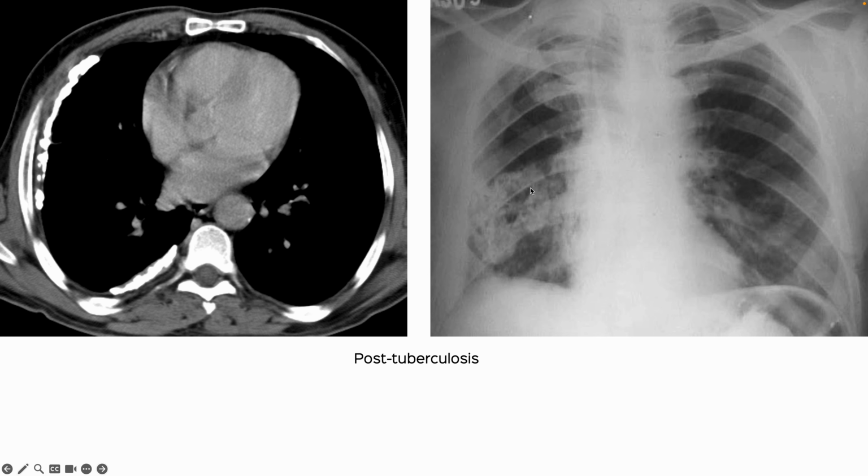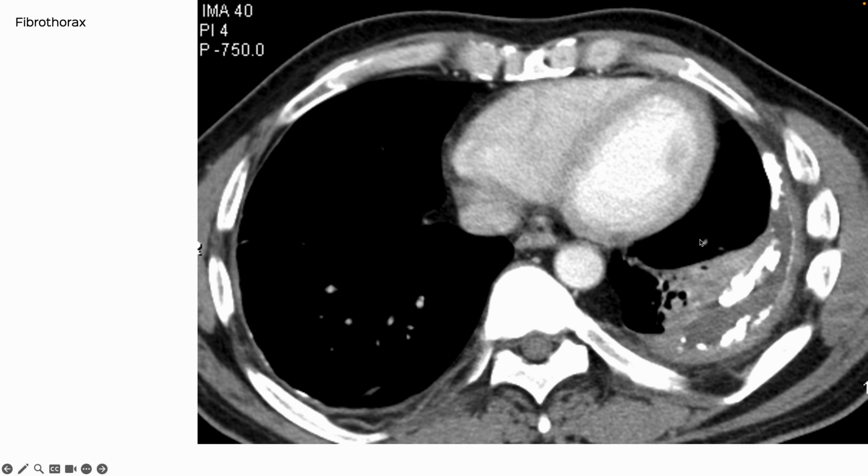Now, this is classic. I don't think anything looks like this otherwise. And so, pathognomonic for pleural calcification. And we've discussed post-tuberculosis lung disease or PTLD a couple of times in this YouTube series. That's another patient. Again, not an uncommon appearance.